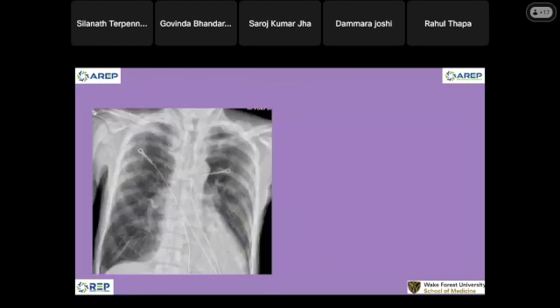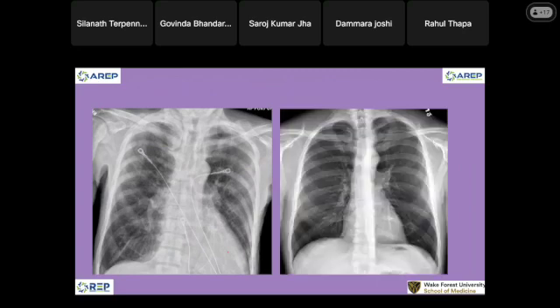So in the elderly, what about this one? I will say, okay, I see here it's likely a pneumonia. Compared to normal, suppose a 65 years old comes in with no symptoms. This one has no symptoms at all. This is definitely cancer. A 65 years old smoker comes in with symptoms. This can be pneumonia, can be cancer.